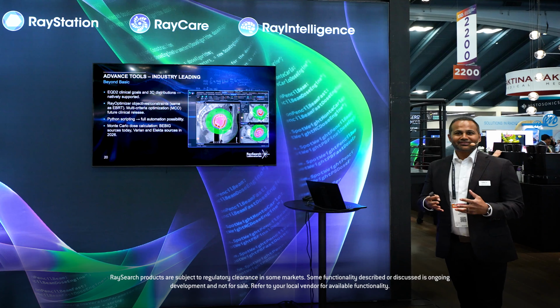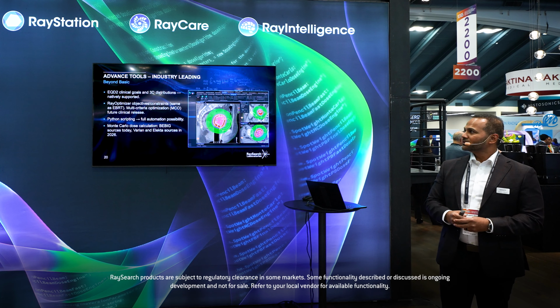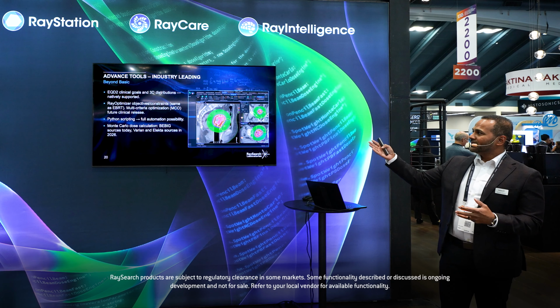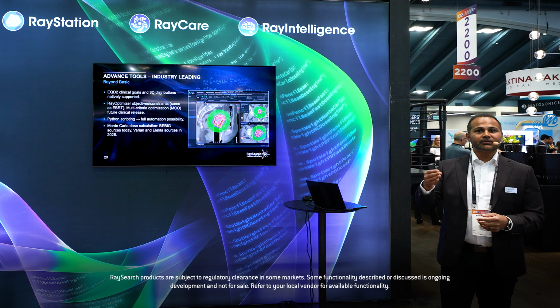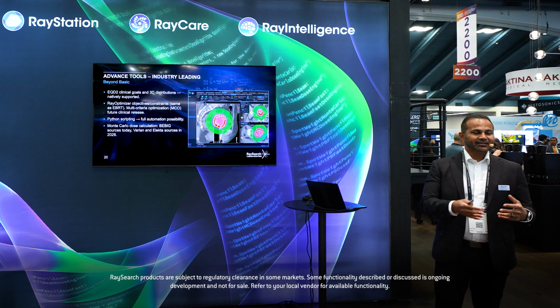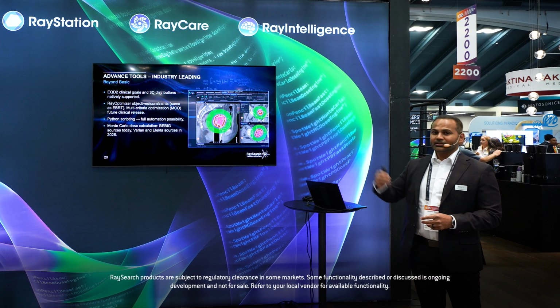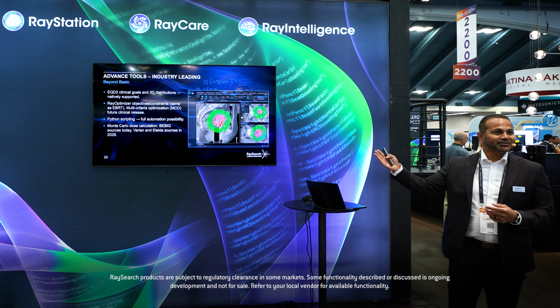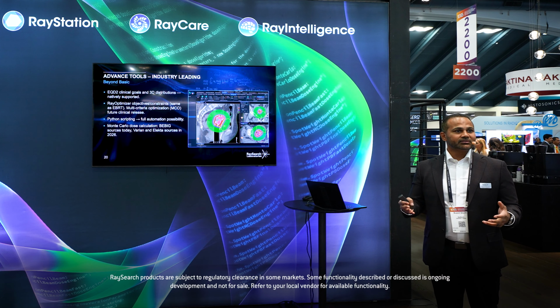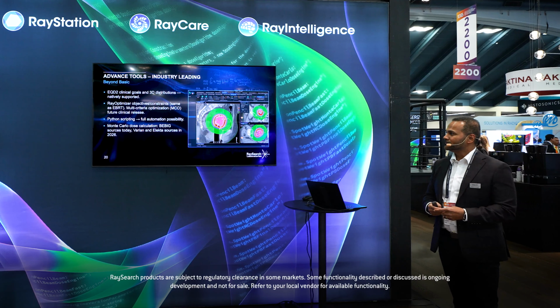Then, of course, RayStation provides the advanced tools that many clinics want. The built-in two gray equivalents, clinical goals, dose distributions, and we have the RayOptimizer where you can make use of objectives and constraints like you do for external beam planning. That is not the case for other vendors. Something that I'm excited about is the multi-criteria optimization, MCO. That's currently released in our research version, and we're hoping for a clinical release soon.